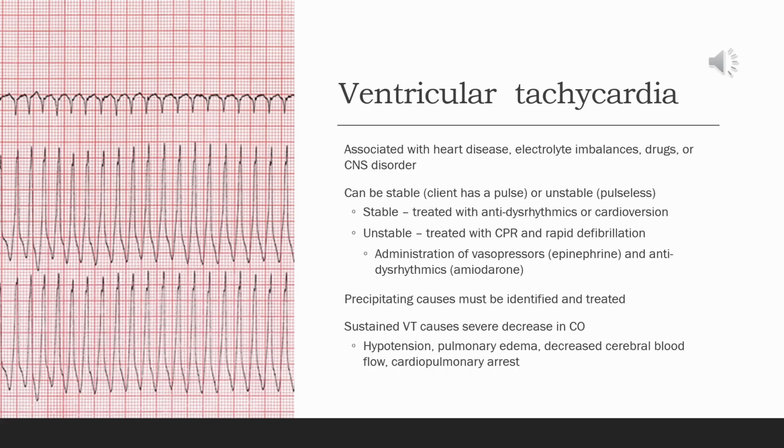So remember, if you ever see this rhythm on a monitor, we need to act fast because this is a code blue situation and every second counts.